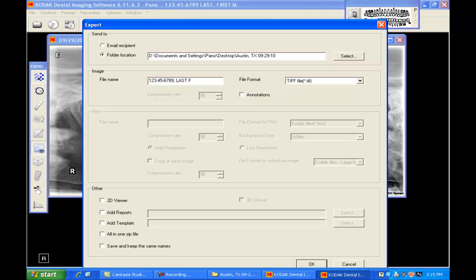You will now type in their first name. You will put in another space. Don't worry about a middle initial or anything. All you need here is first and last name, but you will type in PG01, not the letter O, but zero one. If it is an O, it's unaccepted. It has to be PG01. Each and every patient will have the same thing after it. It will all be PG01. Once you've done that, come down here and click OK.